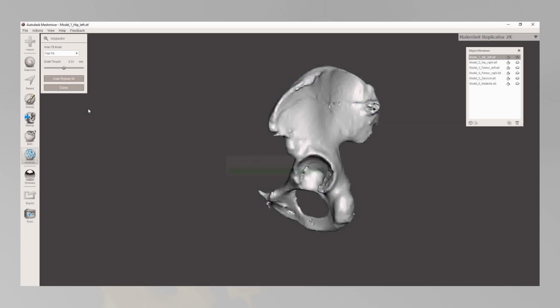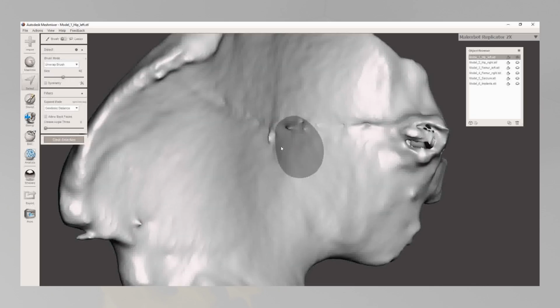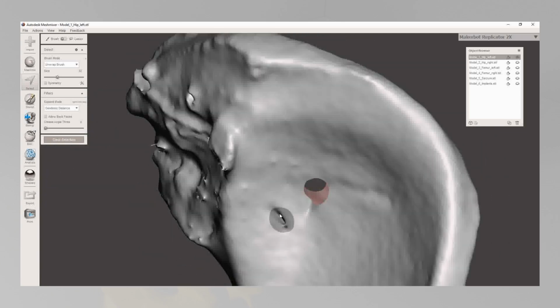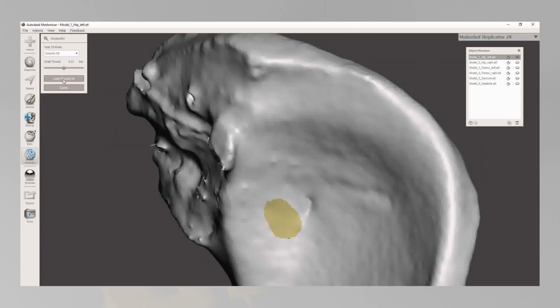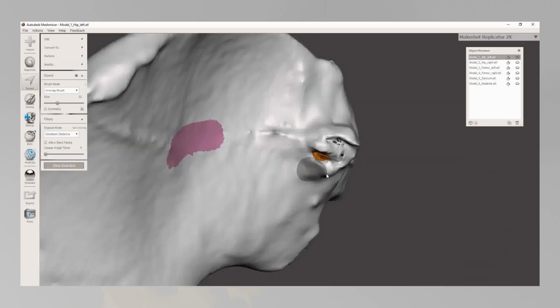After importing, the 3D model is checked for defects and inconsistencies. Remaining gaps and holes are filled to get a closed surface. Internal structures representing the spongiosa are also eliminated, as they will be mimicked by the infill structures of the final printed model.